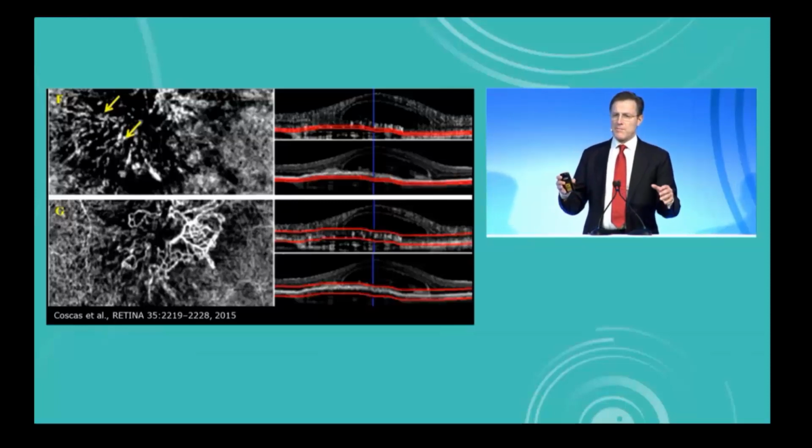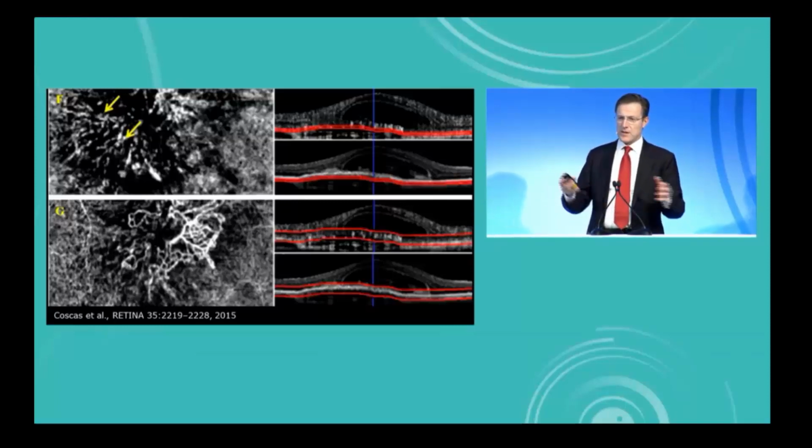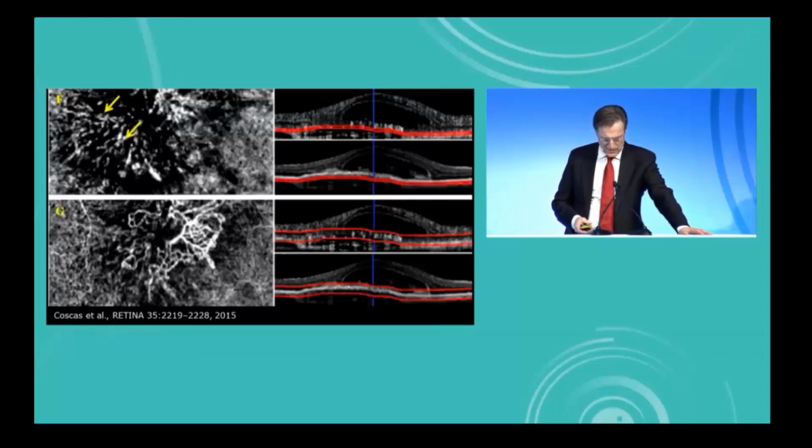And they show very, very different patterns of branching. One spreading centrifugally, the other being tangled and confused. And consequently, there's a lot to learn, and you will understand immediately that when you try to follow patients during the course of treatment, you will have a challenging task here by finding out whether things are regressing, expanding, stable, exuding, or becoming more dry.